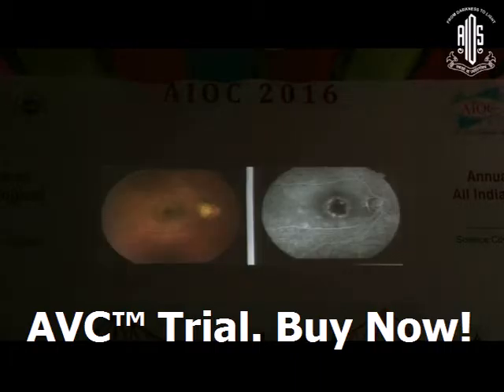There are two varieties of serpiginous choroiditis. One is a classic variety, which was shown in the previous picture, and this is a macular variant of serpiginous choroiditis. The location is in the macula. This is more devastating for the vision. Otherwise, the clinical appearance is the same.